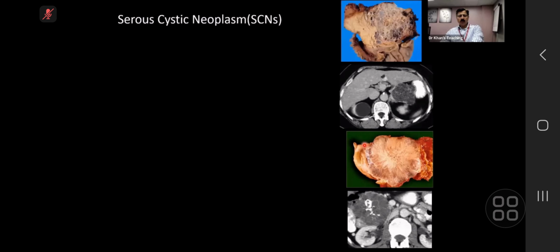So, now, what are the take-home points as far as serous cystic neoplasm? If you see, first of all, these pictures, you can make your radiology from here. First of all, a disclaimer is that in the real world, at times we cannot discriminate between the two. But the examiner has to show you a classical picture for you to be able to pick that up. Now, this picture tells you everything, that it has got multiple small cysts.